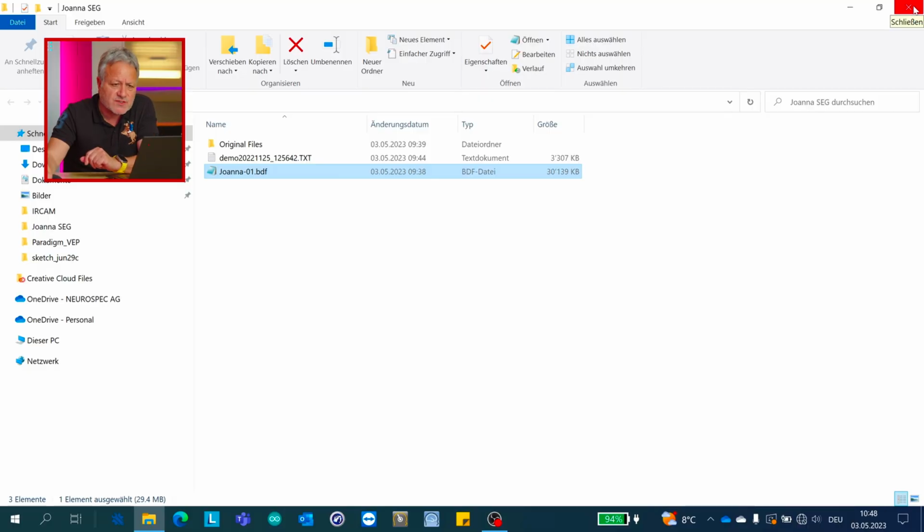Be reminded, we've cut out some channels on the EEG because the cap that we've used, as you would have seen on the video, is an old cap that we've borrowed from a hospital in Switzerland. The labels were coming off a little bit and some of the holders didn't work, so we couldn't put the electrodes in properly. So we decided to actually show 8 to 10 channels of EEG, which is fair enough. Okay, so this is where the files reside.